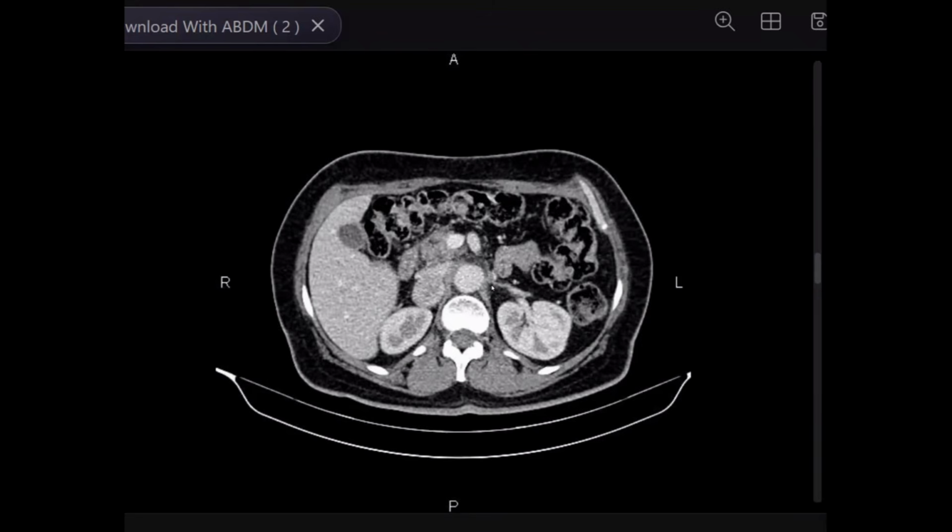It can be paraganglioma, and it is paraganglioma. Okay. Yeah, so the sympathetic. The most important question for the physician is to ask: is the patient complaining of hypertension or not, or resistant hypertension or not? Yeah, in this case, really presenting with hypertension, searching for paraganglioma, and it was paraganglioma.